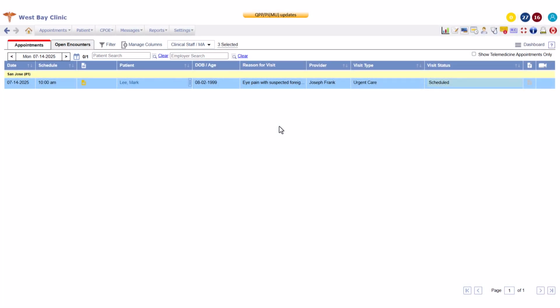Welcome to the Radiology Interface Workflow video for Prognosis. In this video, we'll cover how to place electronic radiology orders, review incoming results, and troubleshoot common issues. To begin, log into Prognosis and access the radiology order screen for your patient.